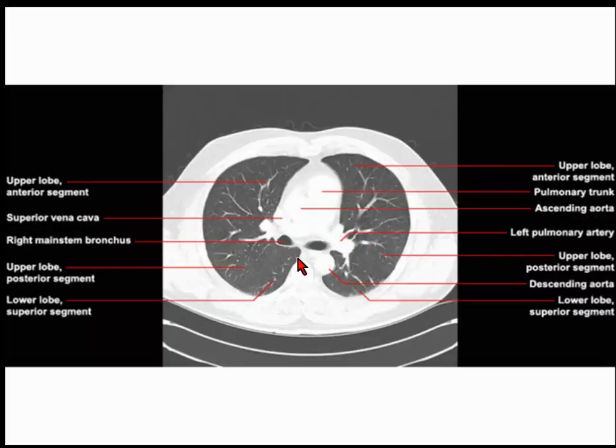So this has divided, now it's going into the main bronchus. So again, still you have got anterior. Just remember, very simple, it runs anteriorly all the way. The apical has disappeared now because you have gone down, and then you have still got the posterior segment, which is the upper lobe posterior segment, and the apical segment of the inferior lobe is coming up.